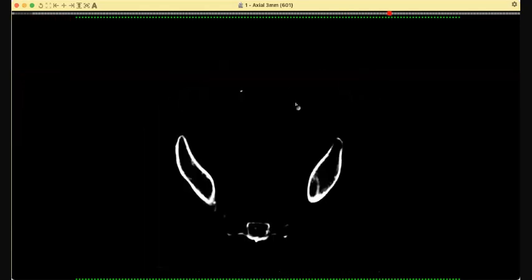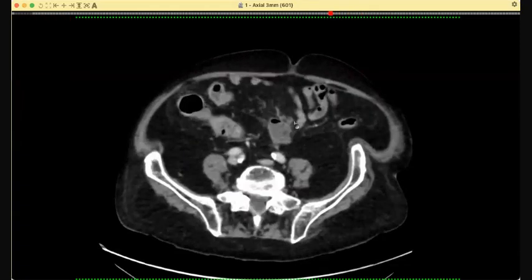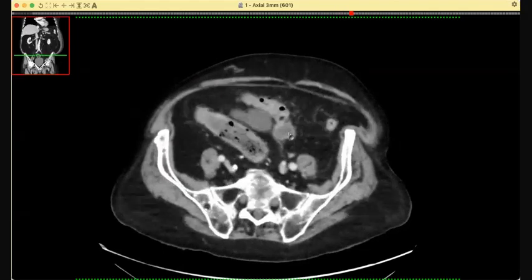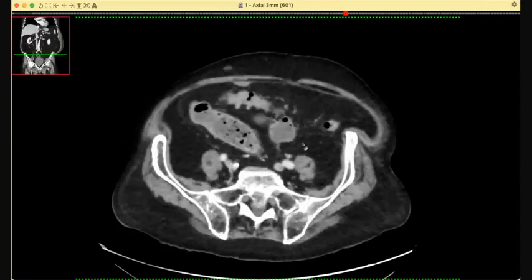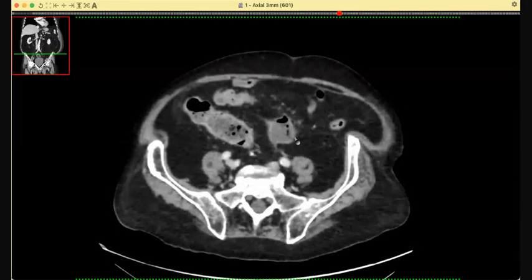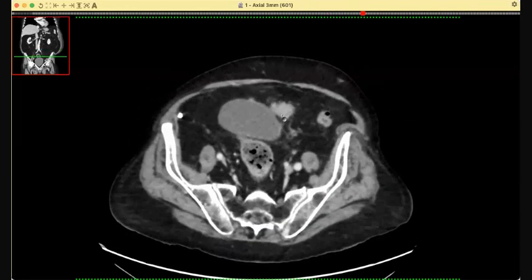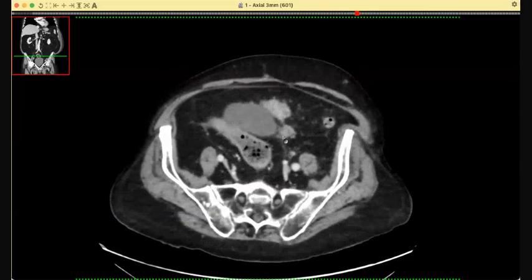They lead this. Can you tell us a source of infection? Now, somehow something is projecting on my screen, but in any case, this was the abscess. This is the abscess. The loop of bowel is next to it. So this is a diverticular abscess.